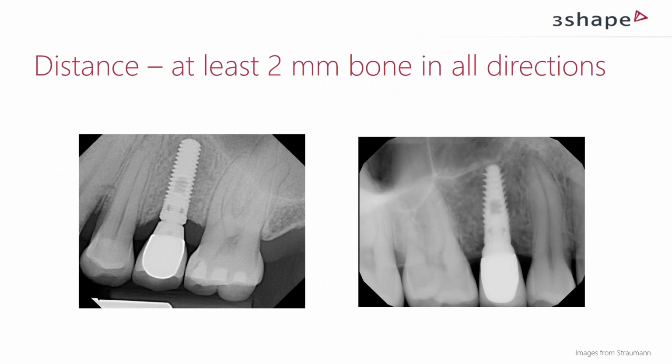So for example, we have these two again. We can see on the left side that there is enough space. The implant is placed like if it was another root on a tooth, and it actually keeps the place of the original tooth, the second premolar that was in this position before. The same with the conical. Enough space for both sides. We're going to get back to this area at the top where we have the sinus to give you a little bit more information about that one.